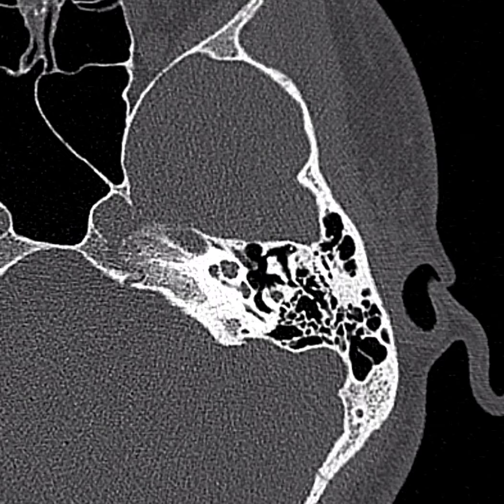When there is lucency in this area, the patient has fenestral otosclerosis. And if the lucency is spread around the cochlea, then they have retrofenestral otosclerosis. When it's just limited here, then you can get fixation of the stapes footplate, causing conductive hearing loss in fenestral type otosclerosis. But when it gets retrofenestral, then you can also have sensorineural hearing loss.